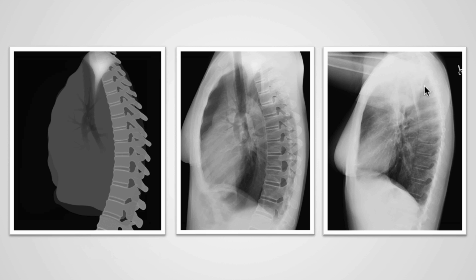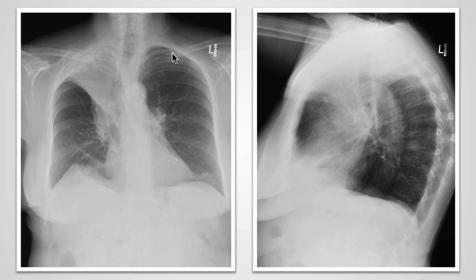In this illustrated case, we can still see the collapse, but that is partly because the collapse was caused by a mass which was located within the inferior aspect of this opacity. Here we see another example of right upper lobe collapse. In this case, we see that the edge of the collapsed lung is irregular. It's lobulated, that there is a protrusion of opacity here more inferiorly.